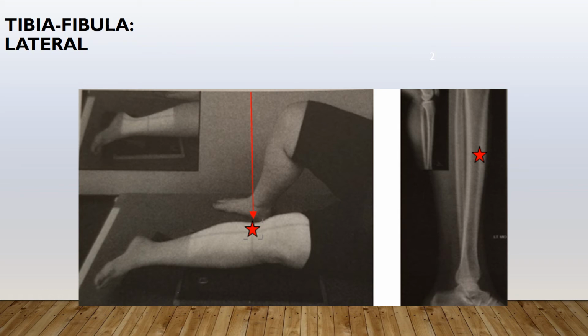When you are examining the image, the entire tib-fib with ankle and knee joints will be included within the collimated field. The tibial tuberosity will be in profile. The distal fibula is going to overlap the posterior portion of the tibia, and soft tissue and sharp bony margins and trabeculation are clearly demonstrated.